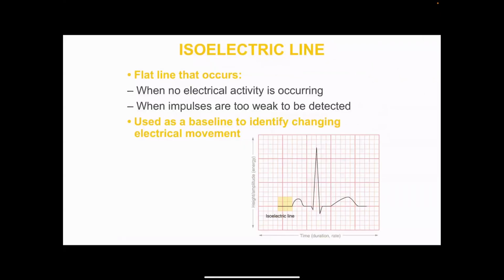Now, okay. A flat line means there's no activity happening.